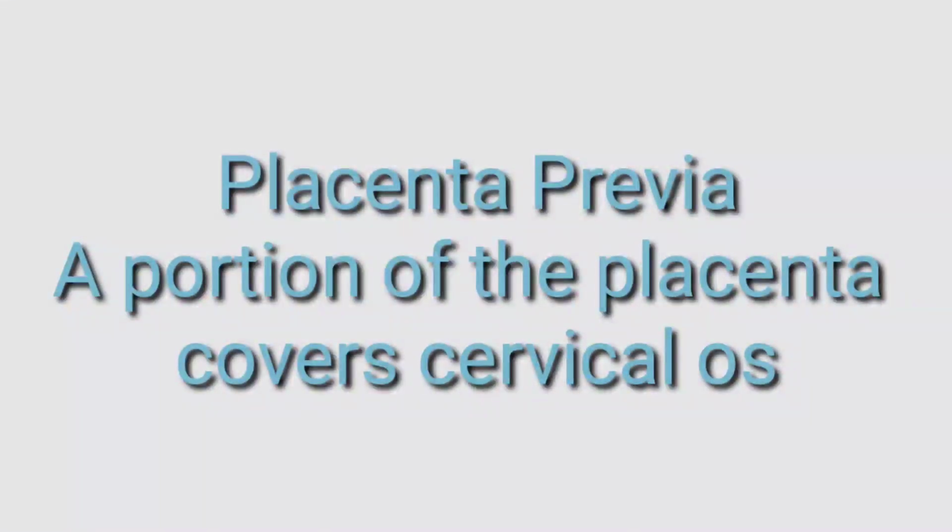So that's why if the placenta is anterior to the baby, it causes problems with the delivery, and delivery will no longer be maintained. There are certain gradings for the placenta. Before going to talk about the placenta grading, it is better to have a look at the anatomical status of the cervix, where the internal os starts, where the endocervical canal begins, and where the external os ends. So let's start by looking at the anatomy of the cervical region.